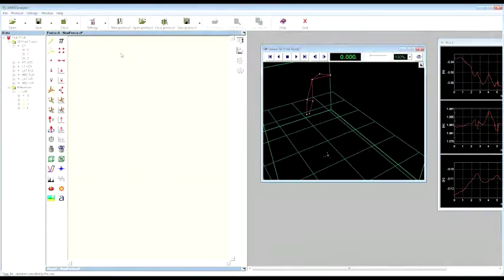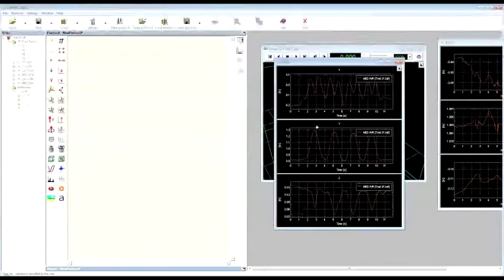So this was just an example about the layout of the Smart Analyzer application. Now we can start using some operators to perform our analysis. First of all, we can start by performing an interpolation over the 3D points. That is a useful operation when you have some gaps in the trajectory, due to the fact that in some frames the markers cannot be visible from some camera, and so the position of the marker cannot be reconstructed. So let me show you an example.